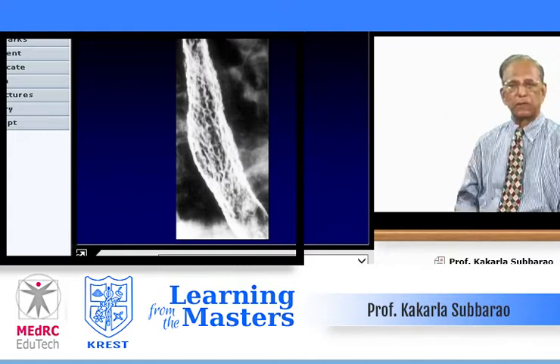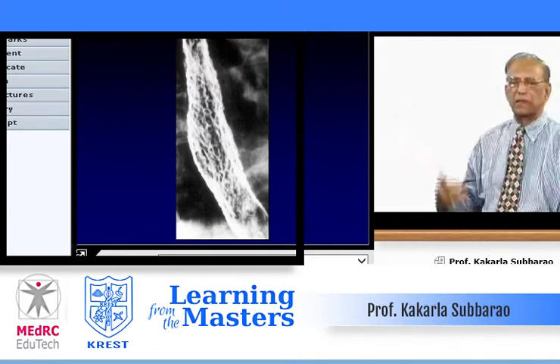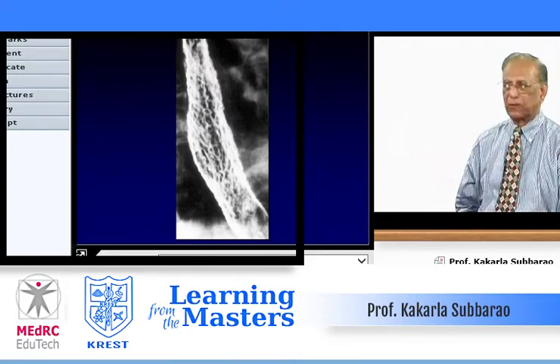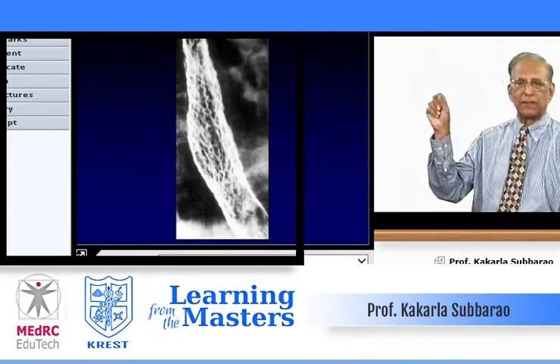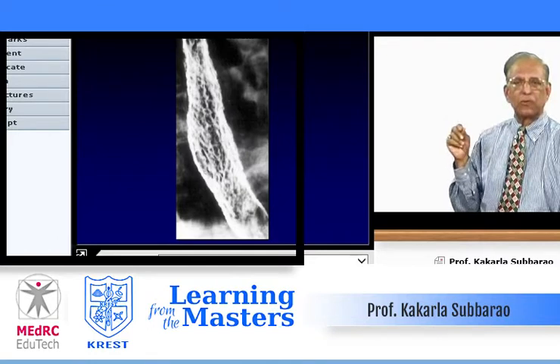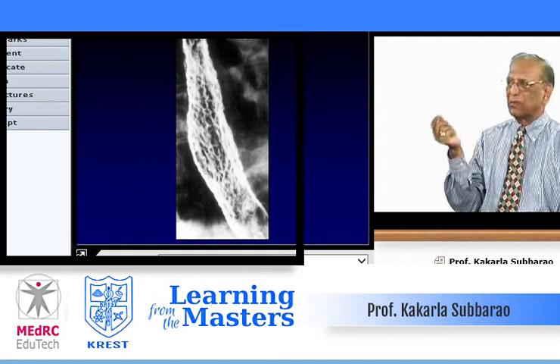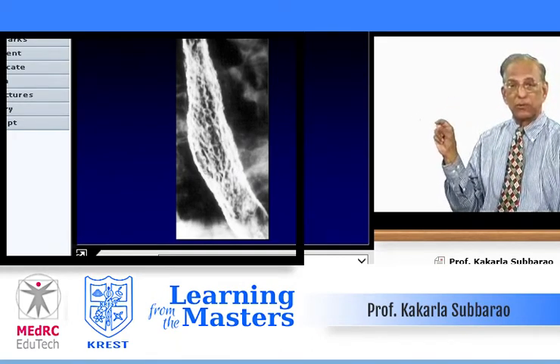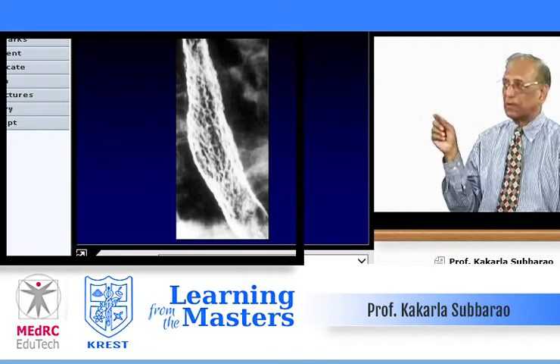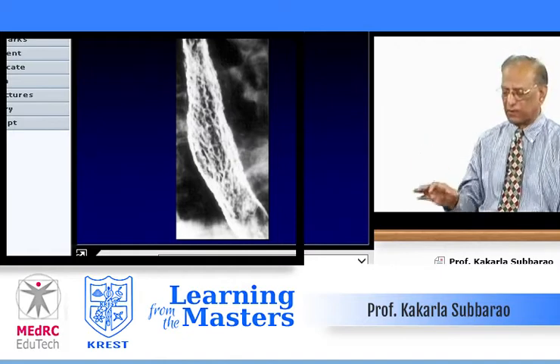And then this patient is a diabetic, chronic diabetic. He developed some lung infection, and this is the dysphagia he developed also, along with lung infection. Colonies of candidiasis. Frankly, if you ask the patient to open the mouth, you can see white patches on the tongue. Esophagus, multiple, simulating esophageal varices, but note the difference. Those varices produce thicker, curvilinear defects, whereas these are the colonies of candidiasis producing multiple filling defects.